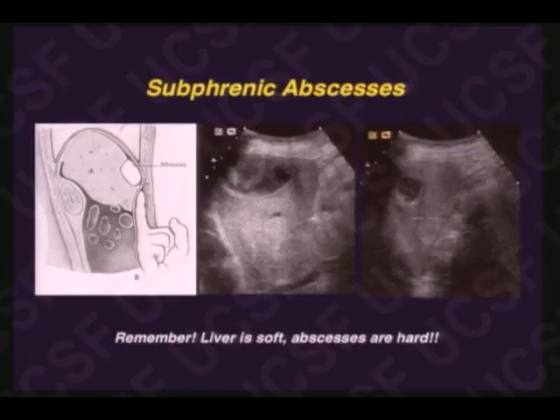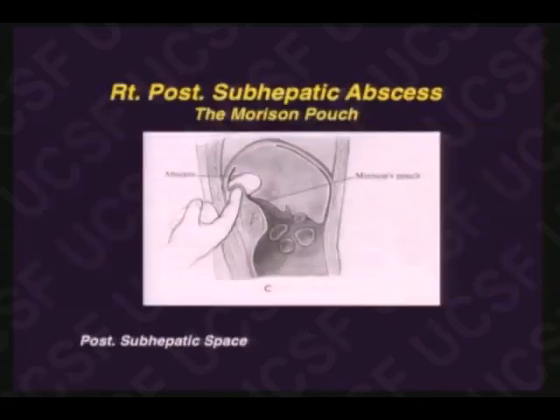It can be very difficult to decide what's in the liver and what's out of the liver when it comes to abscesses in the perihepatic region. Oh, and by the way, that's the one thing on this drawing that I agree with. The artist drew it with a claw sign. Here, the artist also drew this abscess in the Morrison pouch with a claw sign.